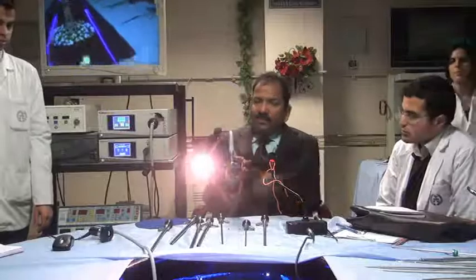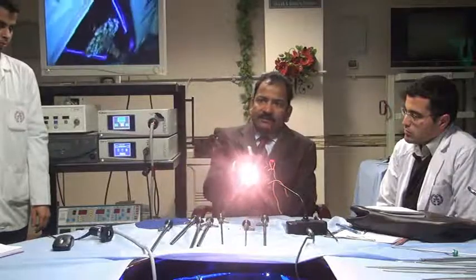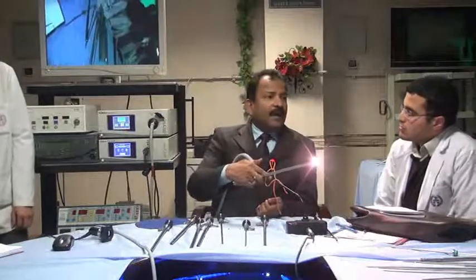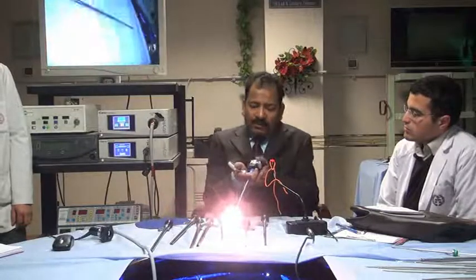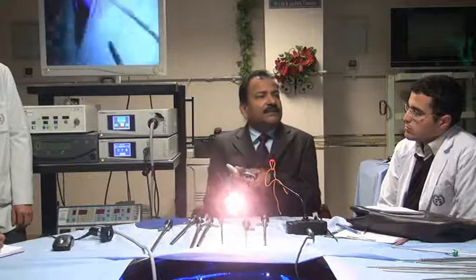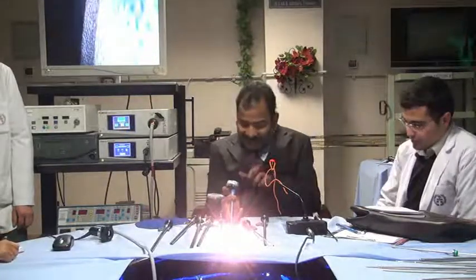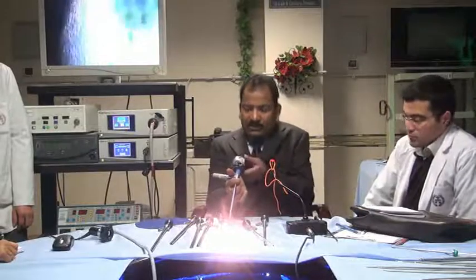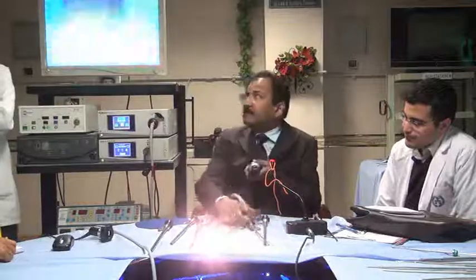Remember, if you hold it this way, there is one more problem: slowly your CCD will rotate. And this is a blunder. See, everybody is upside down. So this should never rotate. If you rotate the CCD, your complete orientation will change. It doesn't matter which surgery you want to do, laparoscopy, cystoscopy, hysteroscopy, retroperitoneoscopy, this CCD cable must be at the 6 o'clock position, and this should be at the 12 o'clock position, like this.